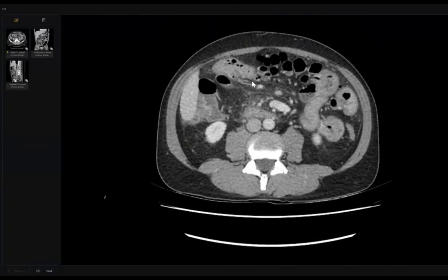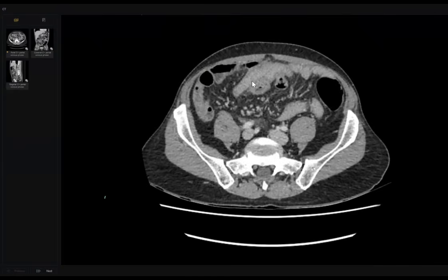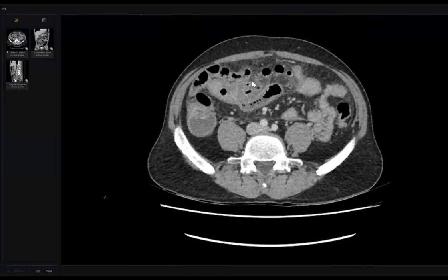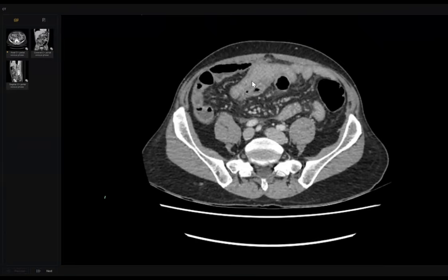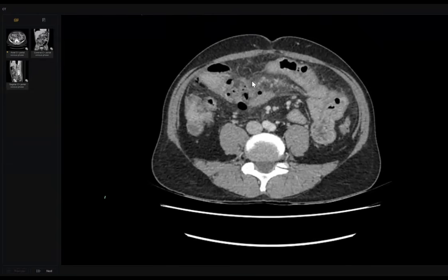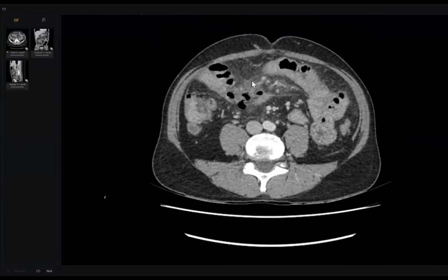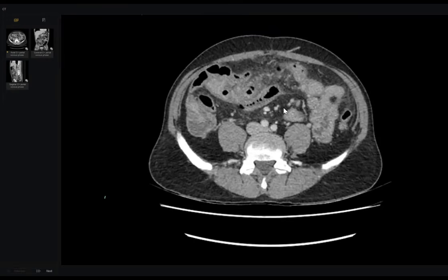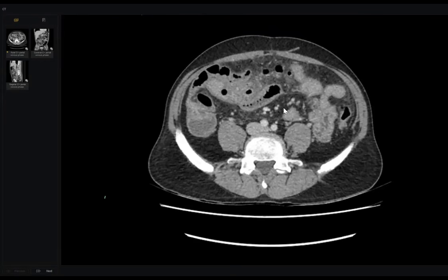What you did first: you have a look and you pick up the pathology here. You are excellent. Then you go back, doctor, I want to examine the mesenteric vessel. Okay, very good, but don't shift until you take an idea here. And tell the examiner, second small bowel loop surrounded by inflammatory changes in the form of dirty or smudged mesentery, indicating an inflammatory process.